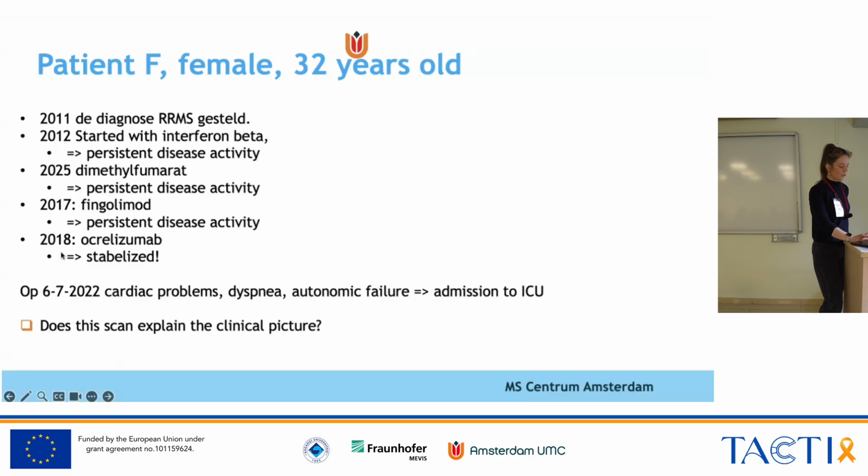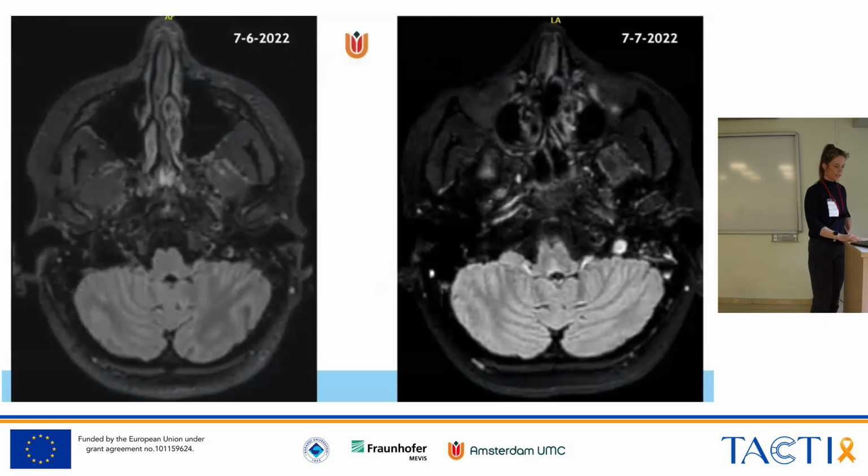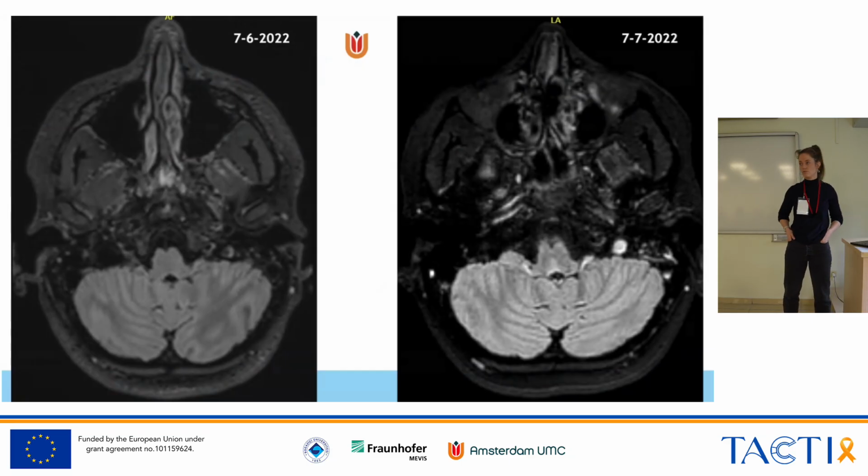And then she started on Ocrevus in 2018. She did really well for quite some years, but then in 2022 she suddenly had a thing that looked like a cardiac arrest, and she had to be admitted to the ICU for care. And these are the two scans. She had one scan made a month prior to this episode. That is the scan that you see on the left, and then you have the scan that was made during this episode, and that is the scan that you see on the right.